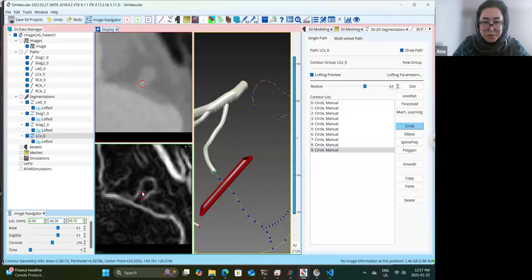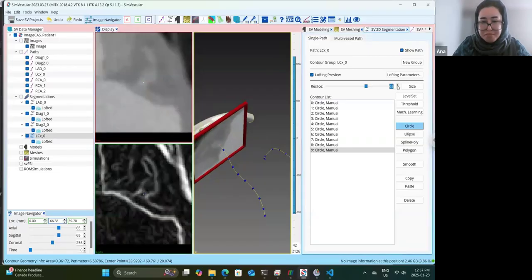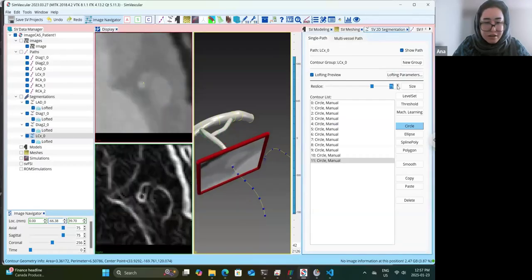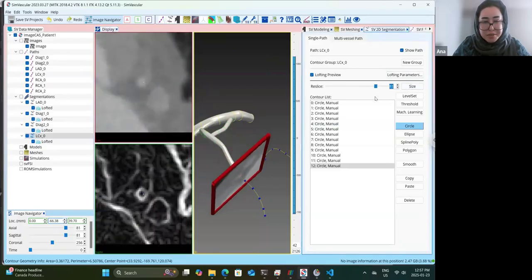So this is the type of problem that I usually have when I segment out LCX. Basically, when you continue segmenting out LCX, at some level it is not visible anymore. Okay, now the resolution got really better. Especially in the gradient image, you can see that better. So I think there was a vessel coming out.